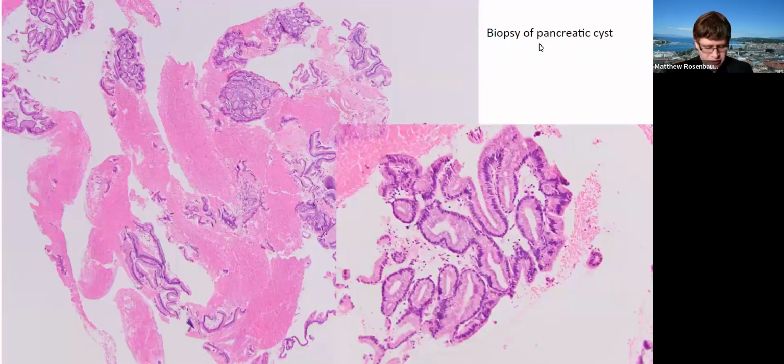The biopsy showed strips of gastric type epithelium, no obvious high-grade dysplasia, no obvious issues here. It looks very similar to stomach, but you see some areas where there is definitely papillary formation, and you don't see any other features that make you think you're actually in the stomach. If you look at the biopsy tract for this case, you can tell they weren't going to the stomach.